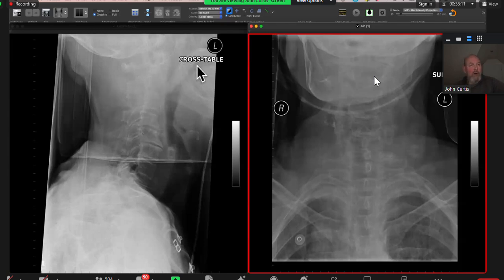So look below the neck. What can you see? Now I am checking the bones in the ribs and the clavicle. The bones are okay. So where else are you going to check? Lung window. Sorry, so both lungs. I want to look at the lungs.